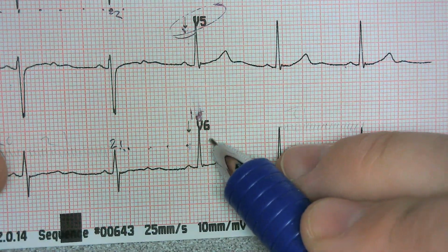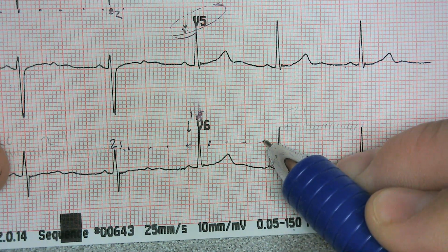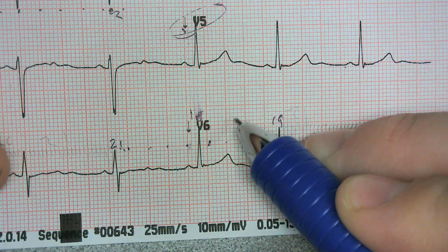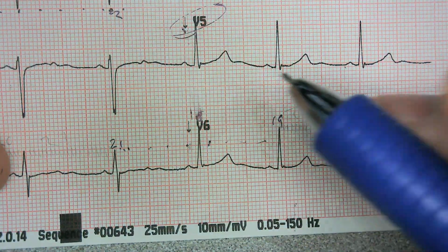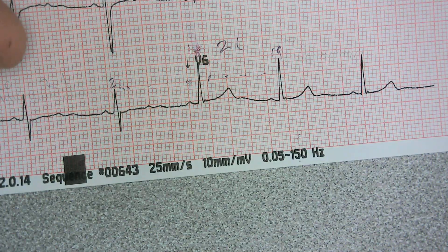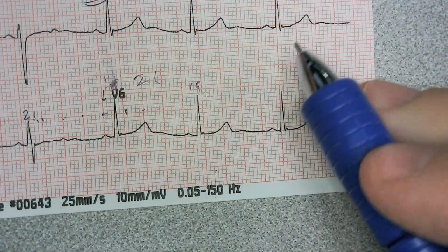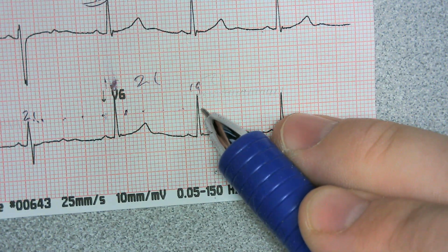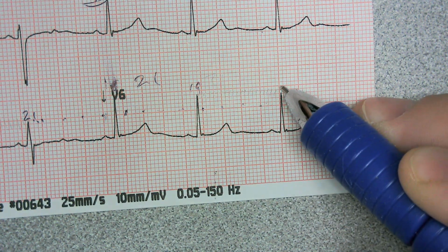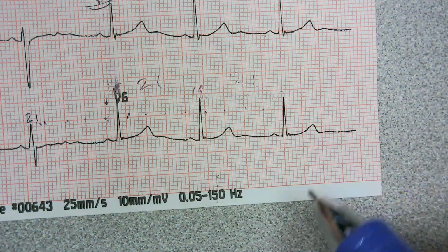All right. So let me focus this again. There we go. All right, so 0, we haven't counted anything. 5, 10, 15. Looks like at 19 because we're 1 shy over there. 1, 2. That's going to be 21. All right. And going over here, 0, haven't counted anything yet. 5, 10, 15, 20. What a gift right on the crossbars. 21.